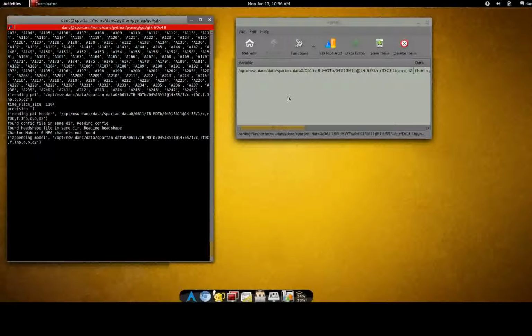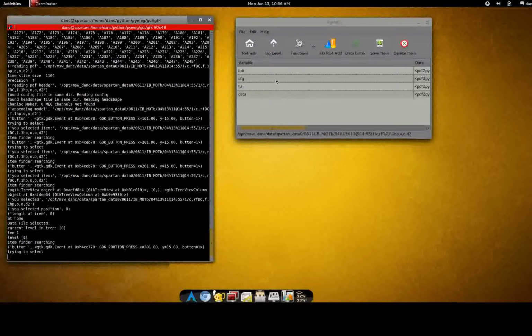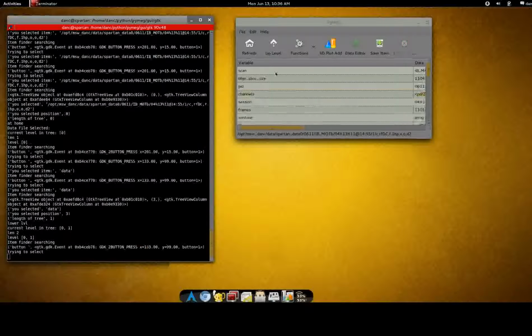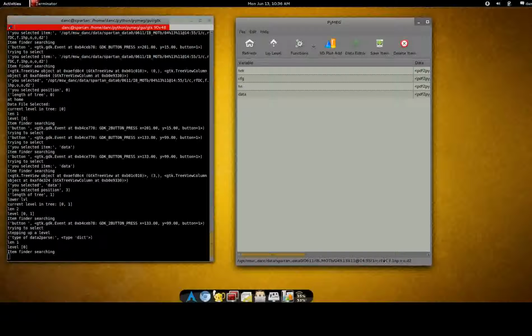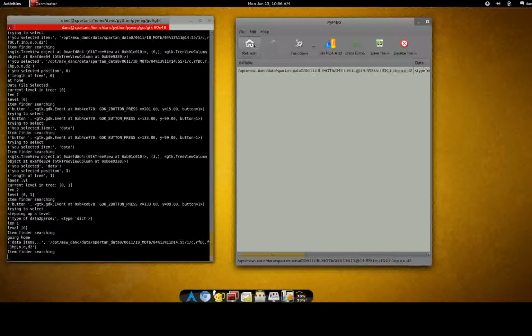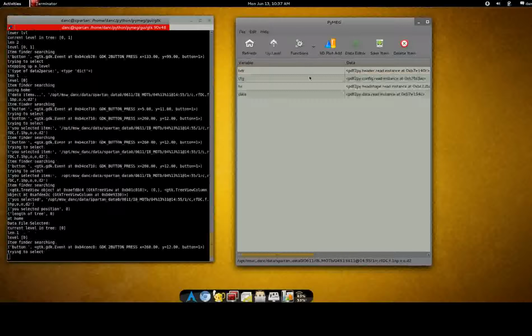At the top level, we can see the data file's name and path. Double-clicking will allow us to see objects underneath, and we can keep delving deeper if we wish. So, going back up, we will load in another file. Let's pre-process this file.